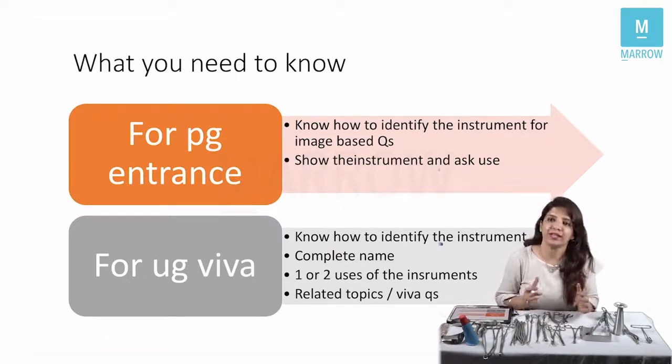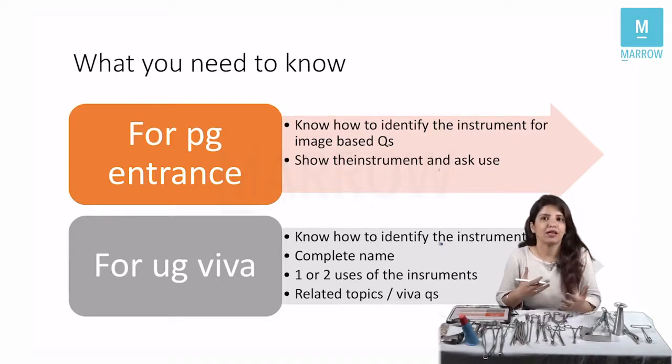Number two, not only that, because in your image-based question, you can be given an instrument. They may show you an image of an instrument and they may ask you, what is it used for, right?